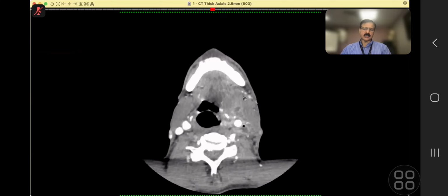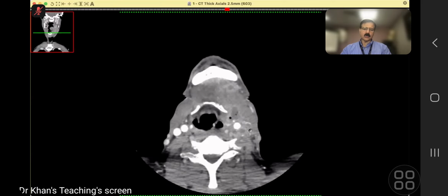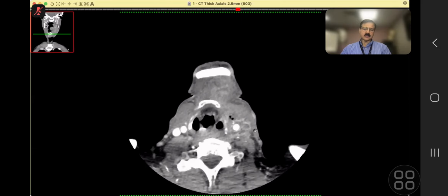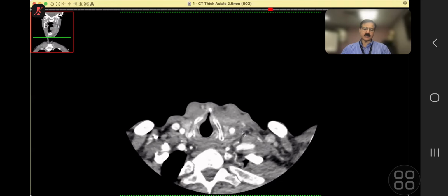Now, as we trace it, of course, these spaces we have already covered. You can see a lot of edema. We have reached the hyoid bone. Abscess here. We continue downwards. Look at this, lot of soft tissue. So this, by definition, will be the visceral space. Remember this.